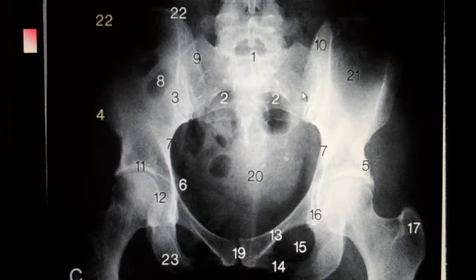Now these dark spots right here, and number 8 is labeling this gas pattern, which sometimes you do have to notice just to make sure that you're not thinking that that is a pathology. Patients also will sometimes be scared by that because they don't know what that is, so you may have to point out that that's just a gas pattern and that it is normal in that portion of the body. Number 20 right here is the coccyx.